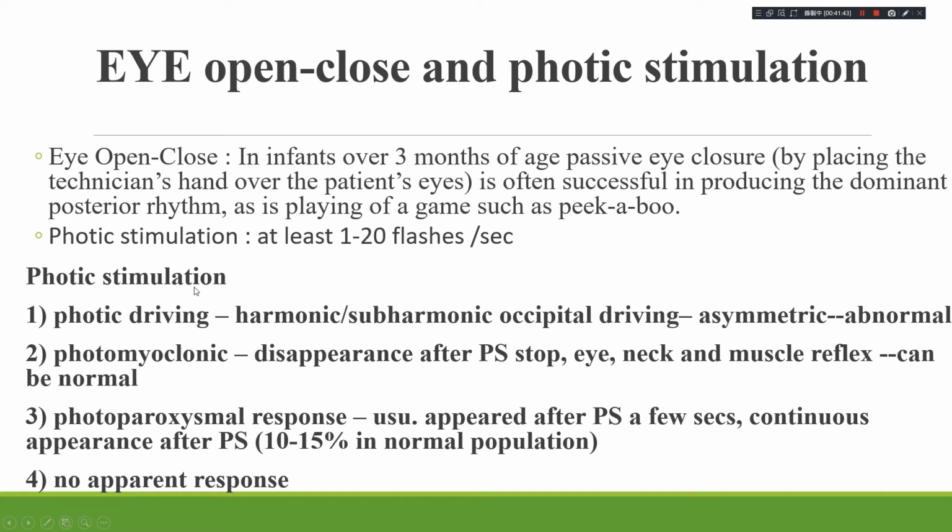With photic stimulation, many children will have harmonic or subharmonic photic driving. If this is asymmetrical, we will consider it abnormal. And the photomyoclonic response usually disappears after photic stimulation stops, and it causes eye, neck or muscle reflex.